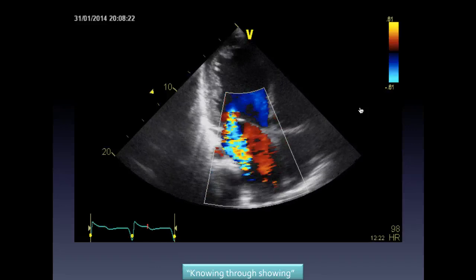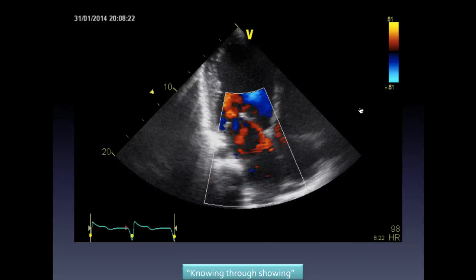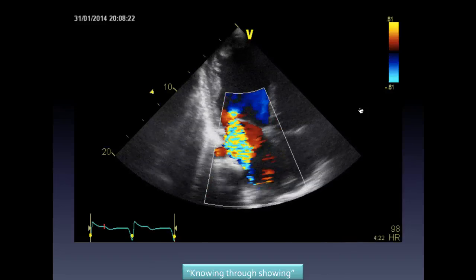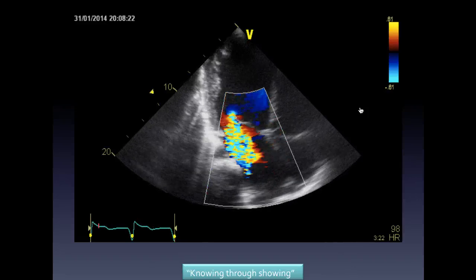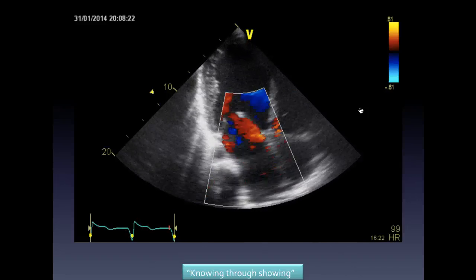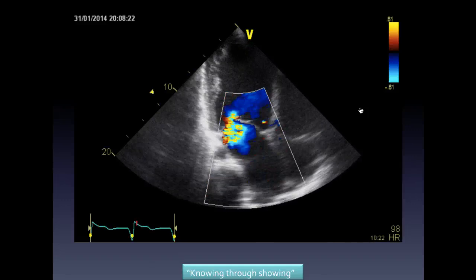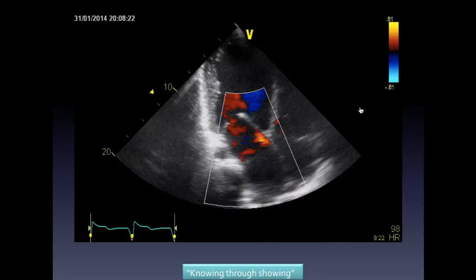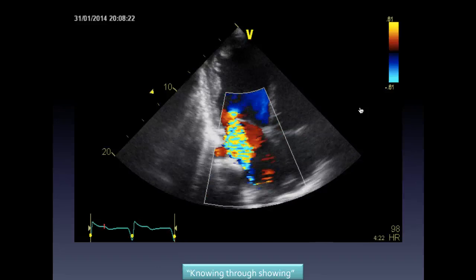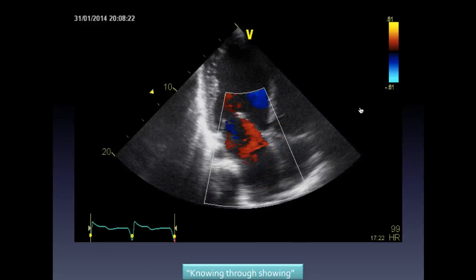Okay? So one of the reasons we see abnormal liver function tests in the ill patient, particularly with the low cardiac output, is back pressure through the liver. But in this young gentleman's case, it is a true case of cardiogenic shock presenting with acute shock liver and all that goes with it. So his actual, again, the assumptions we make on chronically ill patients, his IVC was very minimally dilated.